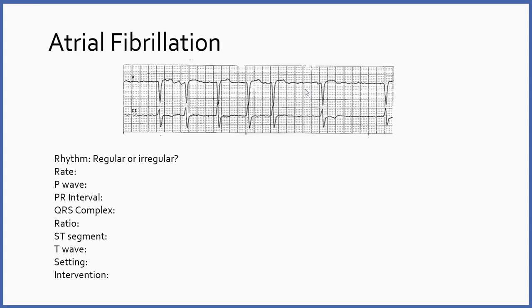You still need to look at the QRS complex. Now, one of the things you have to remember when you're looking at the QRS and looking for T waves and things like that is that the fibrillation doesn't stop. We're still recording fibrillatory waveforms, and so that'll sometimes skew the way QRSs look, and it'll skew the way the T wave looks, okay? So what are we going to do?